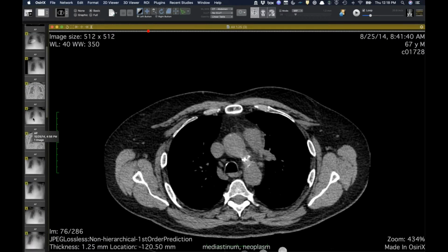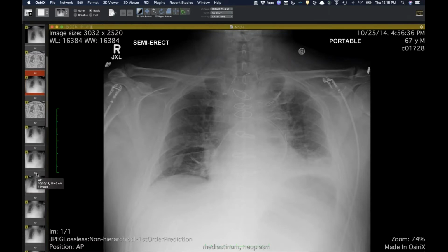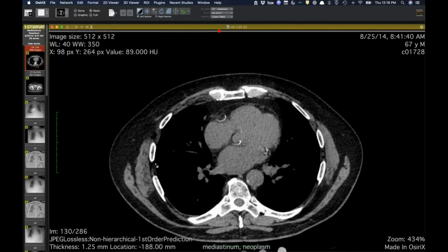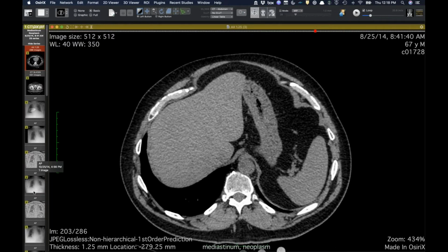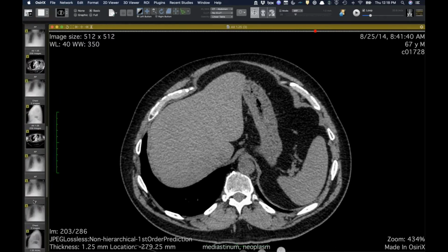They thought it was going to be a thymic neoplasm, and went in and did a median sternotomy and what they thought was going to be a thymectomy. The other reason I show this is that, no surprise, they had to sacrifice his left phrenic nerve when they did the surgery. You can see from the thumbnails the elevation of the left hemidiaphragm.